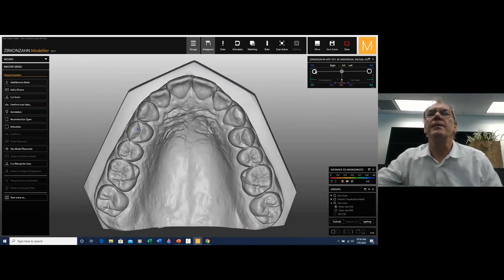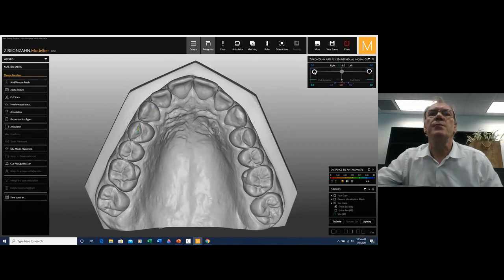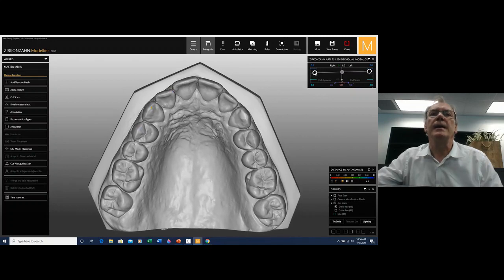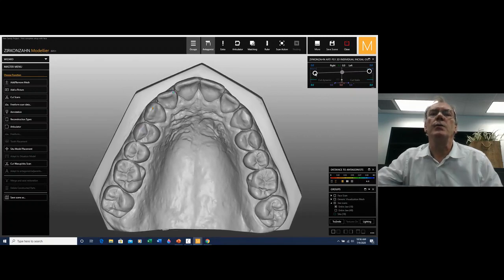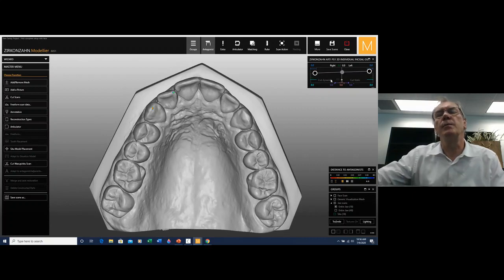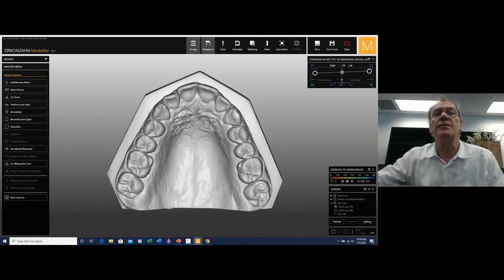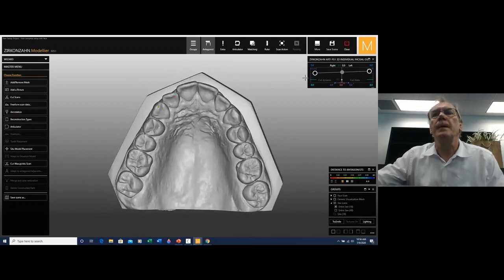And then at the first premolar, there's an interference, and it carries the load for quite a bit until the canine reaches it again. And then towards the end of the border movement, we see that the lateral kicks in. So we're also going to have to evaluate the protrusive and the position of this tooth.